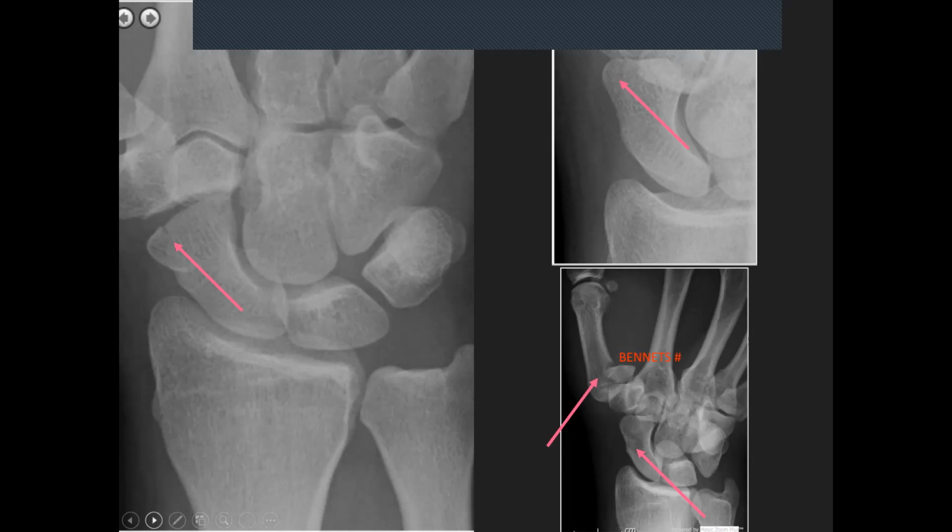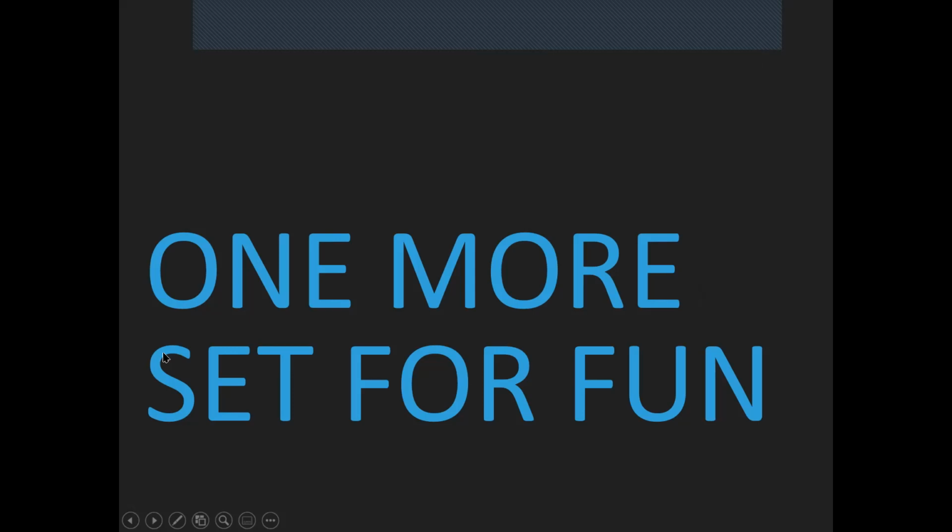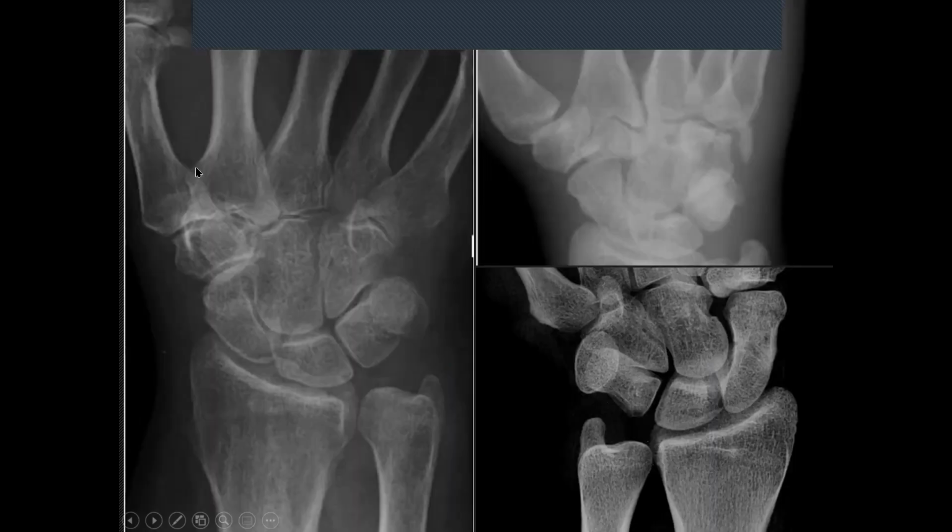Sorry. Okay, so let's have one more. Now, with this one here, I really would suggest you pause the video for about 5 minutes. Have a look at all of these x-rays quite closely. Each one has a fracture. And this one here is quite fun when we do it live. And we have done it live before. It's a lot of fun for me because I get to see people sweat. And I've also seen some people who are natural orthopedics who can just pick out the fractures immediately and know that something's going on. So have a look. It's just for fun. These are not common things. You won't see them all the time. And we'll talk about it afterwards. Okay, so let's have a pause now.